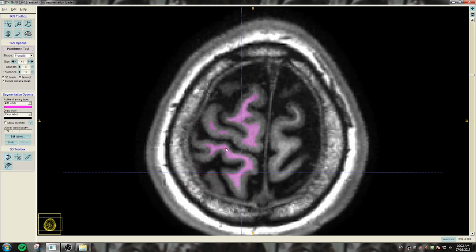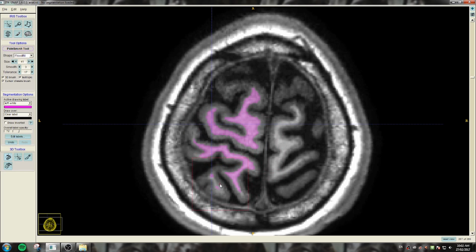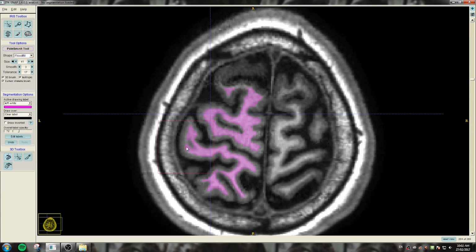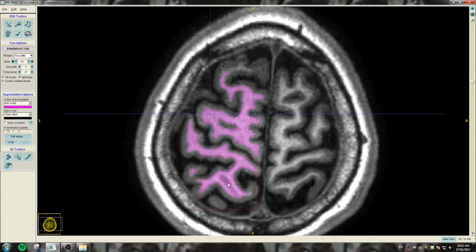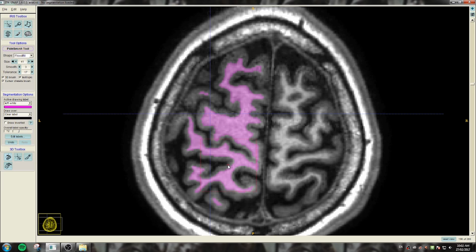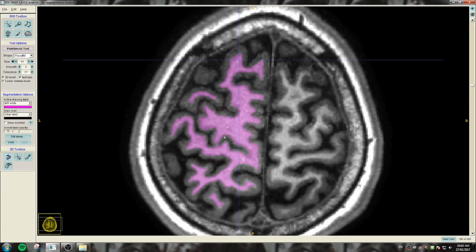So to fill in white matter, what you have to do is use your mouse, and once you've found an area of white matter, you just click on it using the left click button, and by doing this the computer estimates how much of that is white matter or grey matter, and if it happens to overestimate this, you can go to the part that's overestimated and press the right click button on the mouse to erase it. And so basically you'll be doing this over and over again across all the slices in the 3 different views, filling in all the white matter.